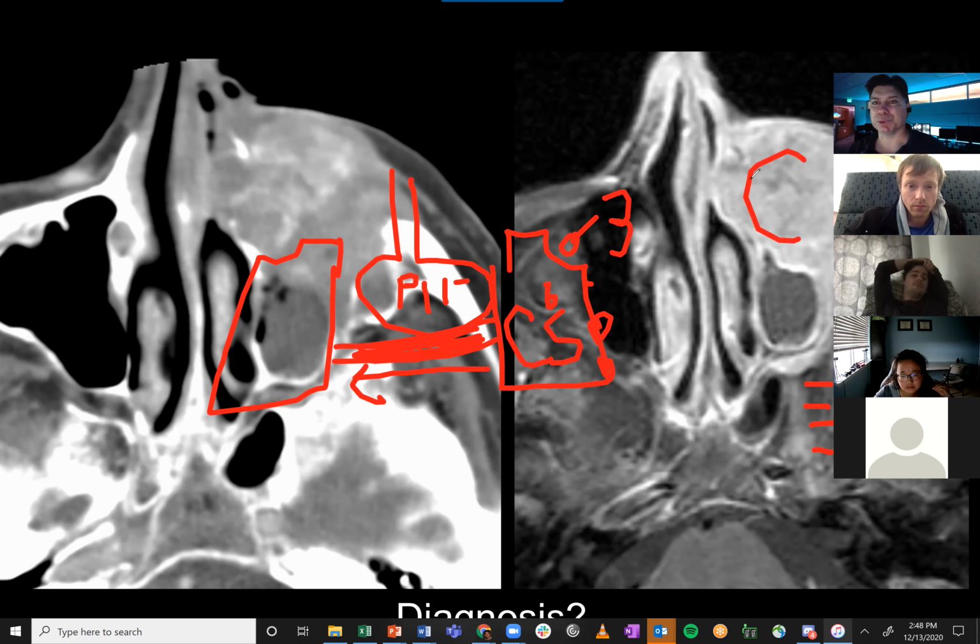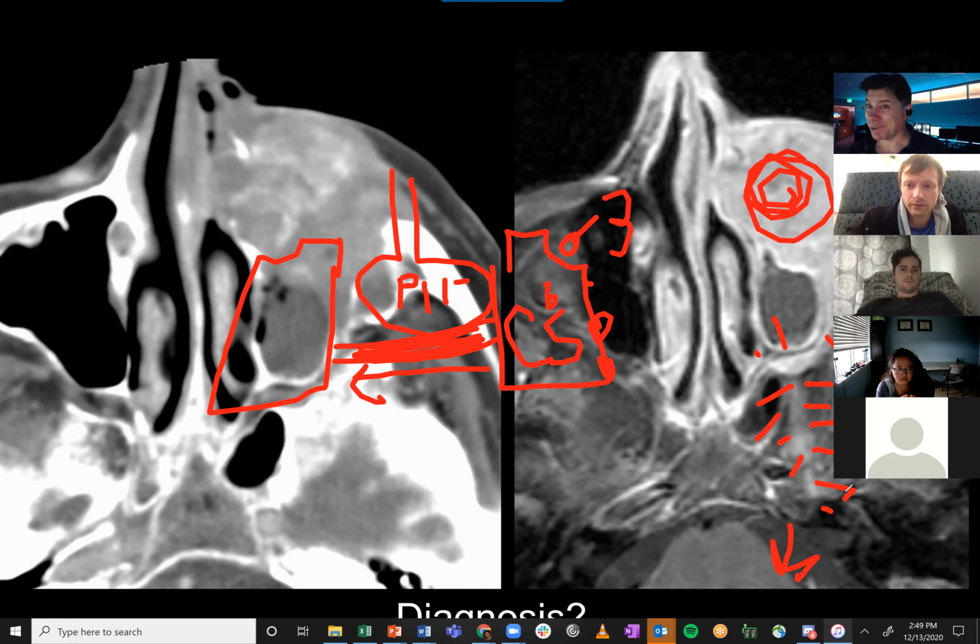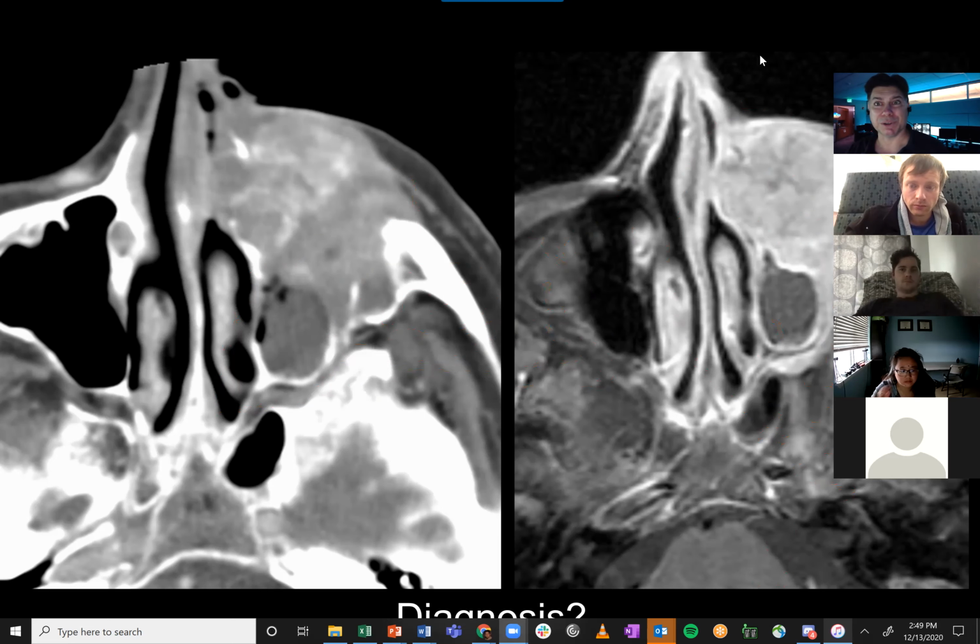So this is perineural tumor right now. The surgeons can see this, but they can't see this, and they can't see this stuff, or if it goes back even further. If this goes all the way back and touches the brain, he's probably not a very good surgical candidate anymore. You're not going to change this guy's morbidity and mortality by doing a big face surgery if it's already touching the pons. So perineural tumor spread is our job to talk about and see where it goes. Good. Okay, next case.